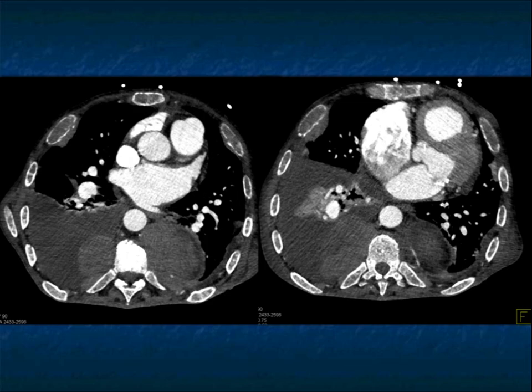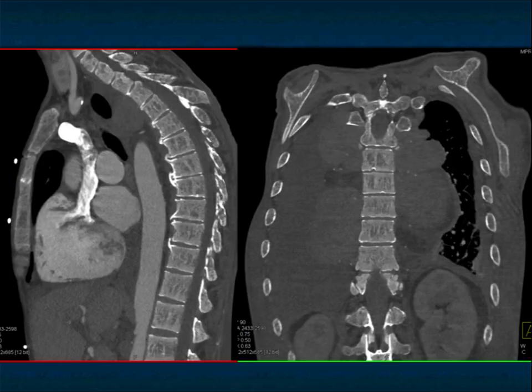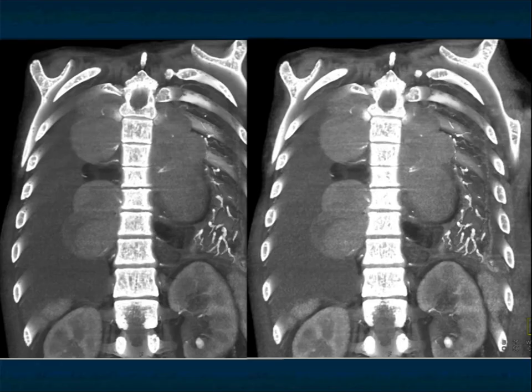So what are we dealing with? Could it be lymphoma with large paraspinal masses? Could it be neurogenic tumors? Could it be adenopathy? But when you look carefully, how do I explain the bone, the coarse changes in the sternum, in the spine, the soft tissue components coming from what appear to be expanded ribs? Well, you know what you're dealing with here. You're dealing with a process that involves the marrow, a process that involves extensive para-aortic areas, and you see it here nicely on the 3D. And so you start thinking, what could this be?